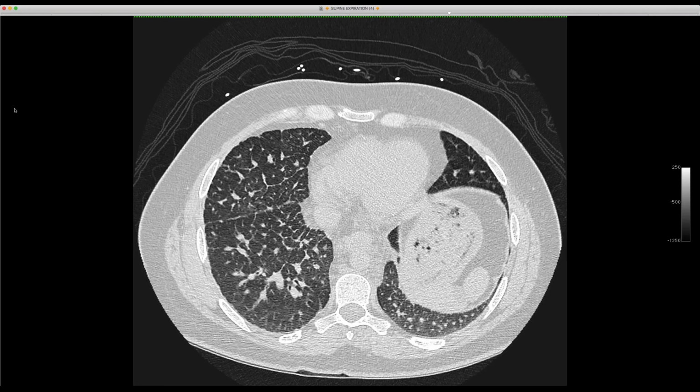And you think those septa are because the septal lymphatics are large? Right. Is lymph in the septal lymphatics, perhaps? That's part of it, which would explain the perilymphatic distribution of this abnormality, the sort of subpleural little outpouchings here and thickening along the fissure.